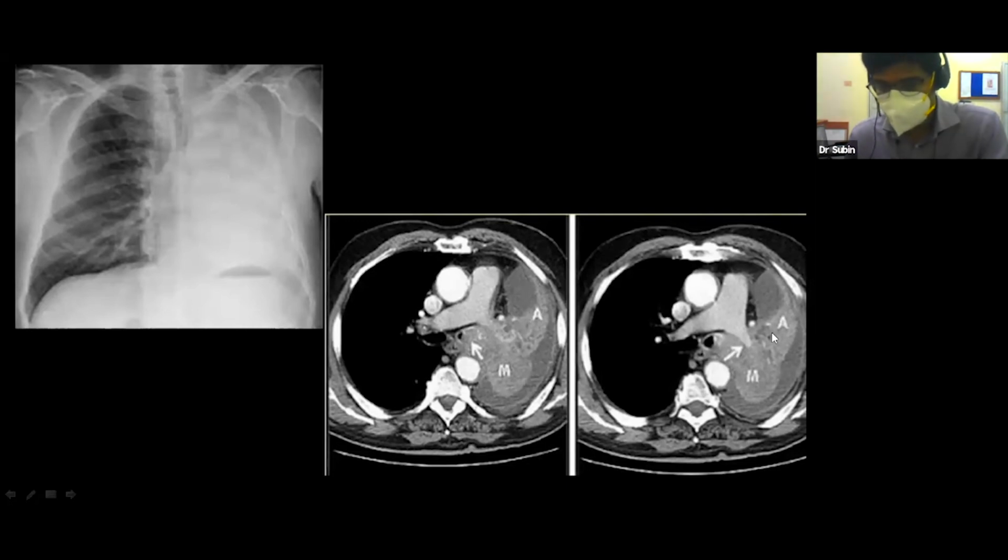So this fluid attenuation is pleural effusion, and this thick bright line that you're seeing all around is the pleural thickening. So there is some pleural thickening, there is this collapse, and there is this mass which is sitting there, and this is the right pulmonary artery. The left pulmonary artery is coming till here and it's getting occluded. I don't have the contiguous sections, but this is completely occluded. And not just that, this is the bronchus, the left main bronchus. You can see the mass is going into the left main bronchus like that. So this is how a malignancy will probably look.